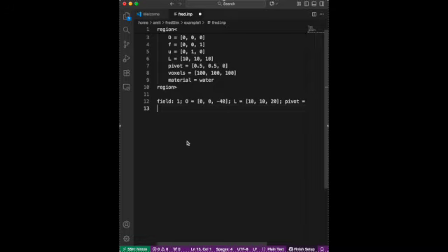Now we have those field ID, the beam. Now we will define our pencil beam. Again, the ID is 1, field ID is also 1. These are just syntax that FRED uses, and you can also find this example on their website.